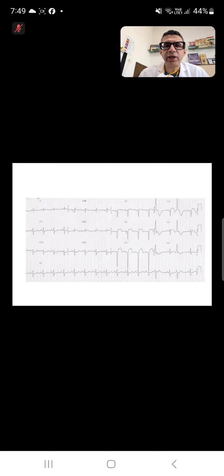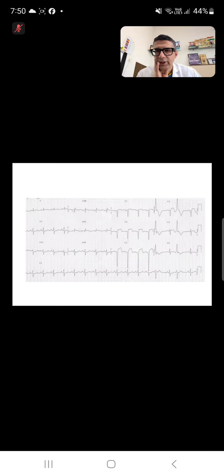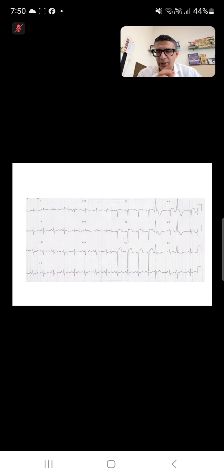Now say this patient had an MI about 4 days back, and this is the ECG. What are the possibilities for these persistent ST elevations? One is evolved anterior wall MI, as you mentioned. Then a superadded acute attack, maybe a re-MI. That means the patient had an MI, the ST settled down, and now had a re-MI because of which the STs have again gone up.